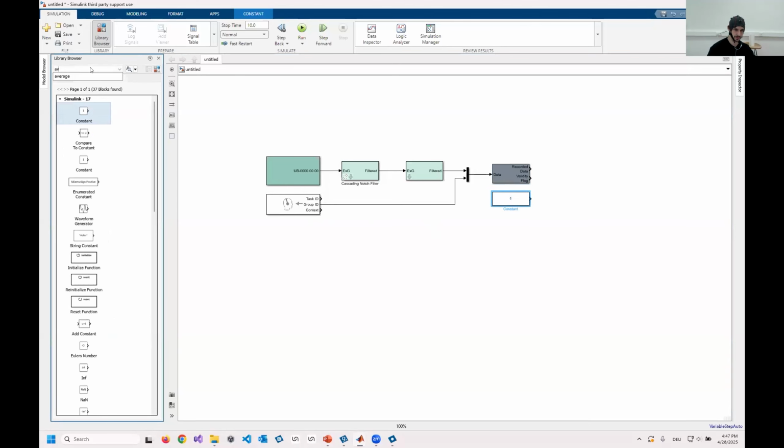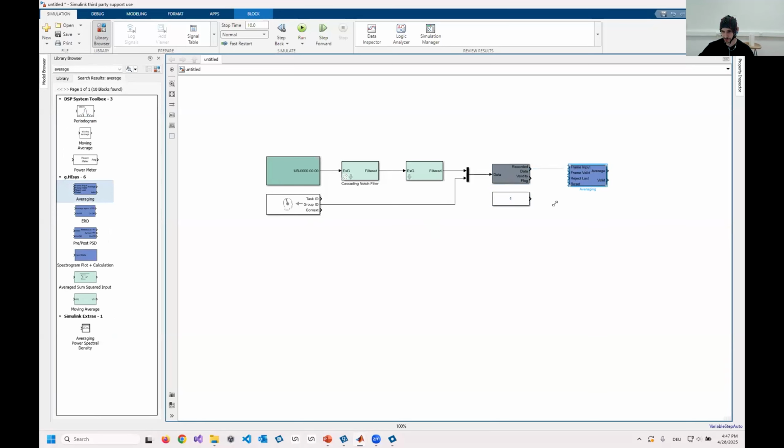And to visualize event-related potentials, we have to average a lot of them together. And therefore, I'm also adding the averaging block. And I'm connecting it to the trigger block because we are triggering at a certain time frame, and we want to visualize the triggered time frame.